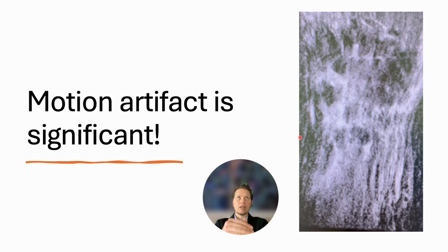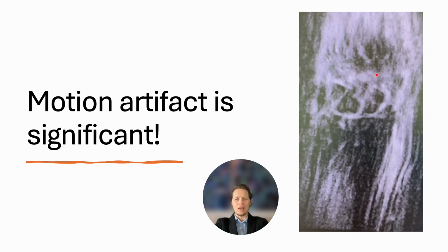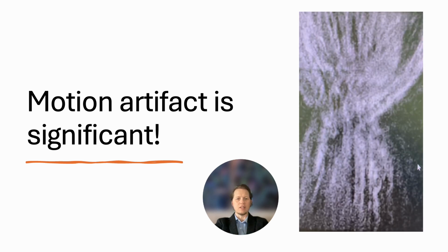When they were taking more sequences specifically for tendons and looking at the tenosynovitis, they got, well, a mess here. You cannot identify much. There is very little diagnostic value here.